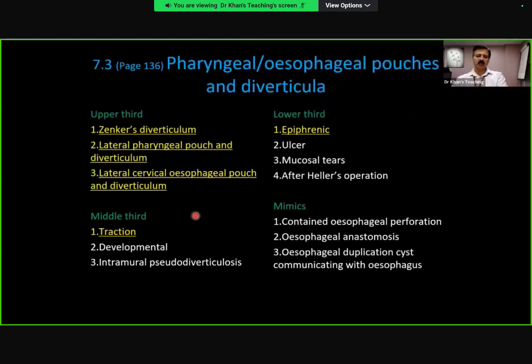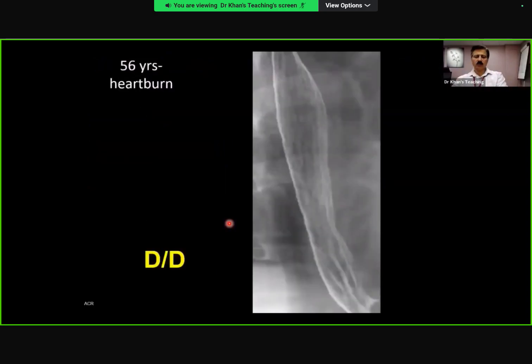So this is the list in your exam, but I just wanted to show you the exam cases which have come or can come. Okay, a mini case for what we call pattern recognition. Just give me the pattern. How will you describe this, Ben? Over to you, please. Sure.